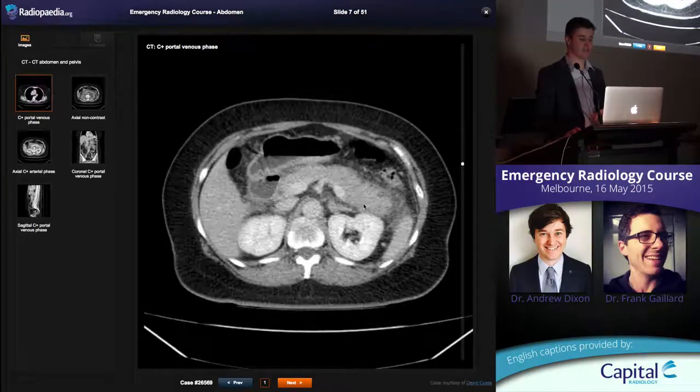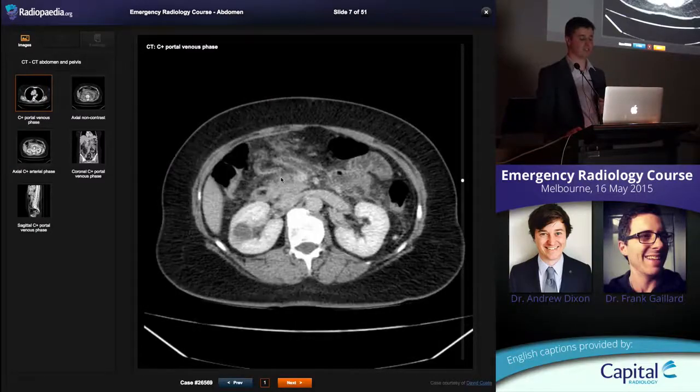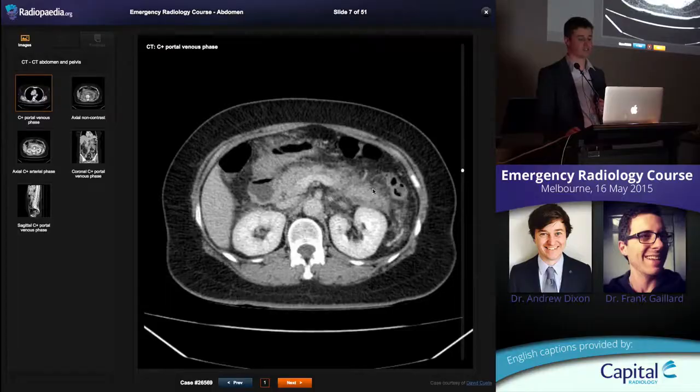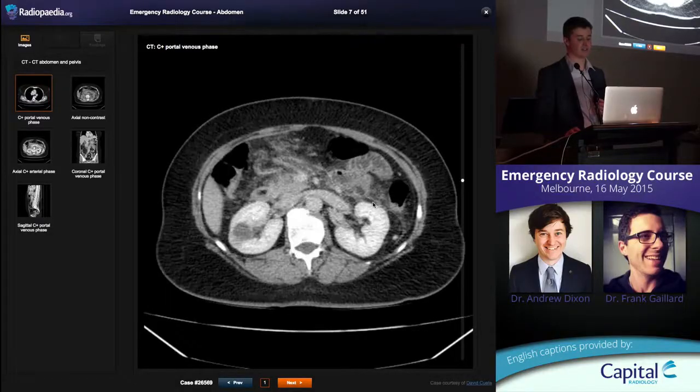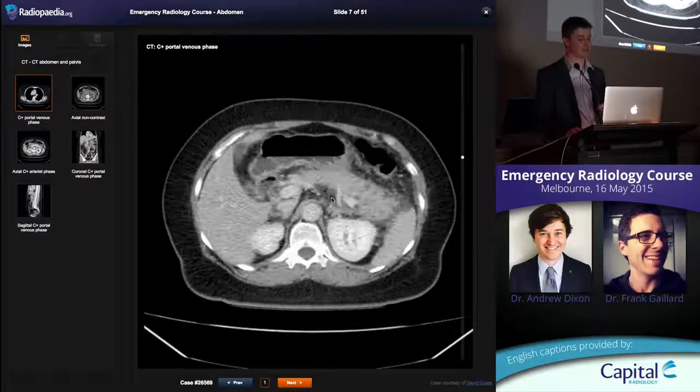So this pancreas, this is a bulky looking pancreas, okay? Slightly lower density than most pancreases that we see, particularly this area in the head here. And look at all the stranding of the fat next to it, okay? Ill-defined margins, all this stranding. It's a retroperitoneal structure, it's in the anterior pararenal space.